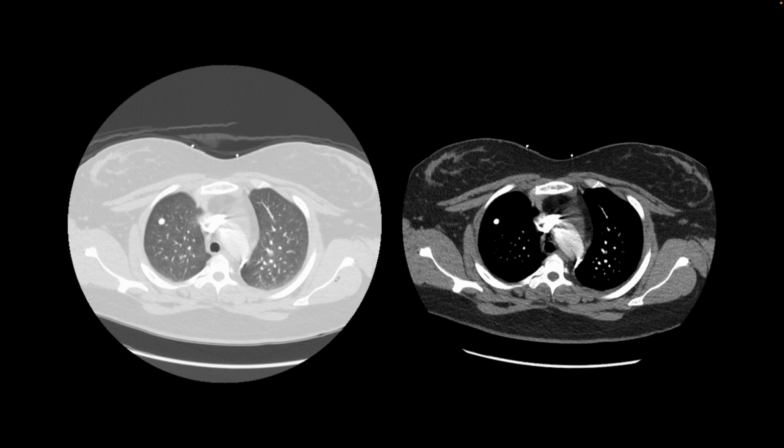Here is another CT of the chest in a patient. If you look at this nodule in the lung window, you may not be able to figure out that this is calcified, but once you change the window to a soft tissue window, the hyperdensity or the calcification in the nodule pops up. And this is a trick I tell trainees to do whenever there's a lung nodule. Switch the window from lung window to soft tissue window to see the calcification better, and describe the nodule as a calcified granuloma, and then move on to the next finding. There's no need to measure this finding.